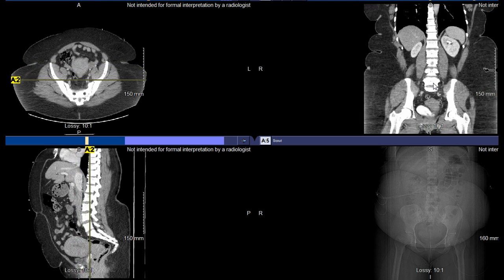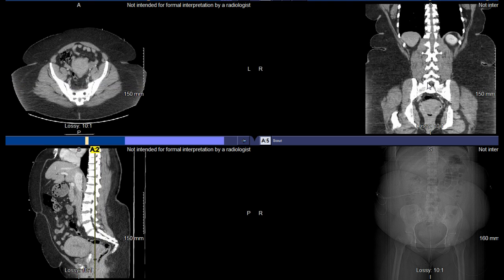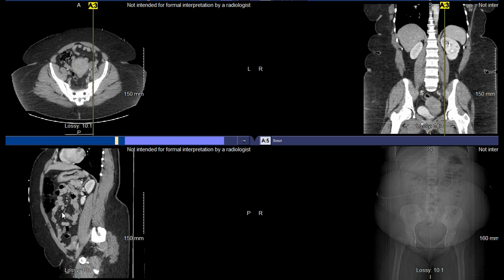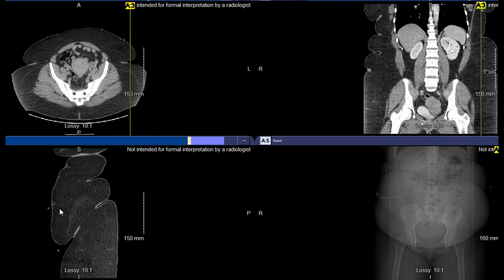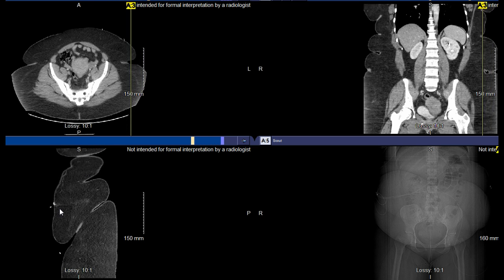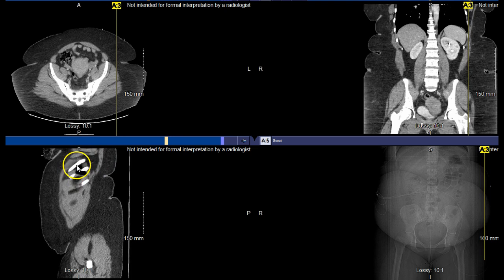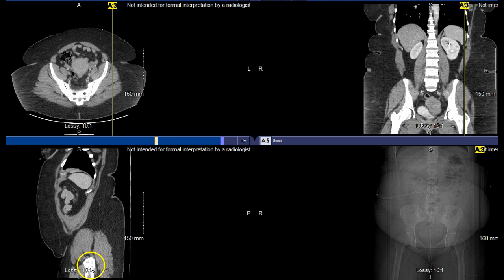So we haven't spent a ton of time looking at some of these alternative orientations, but there's a ton of valuable information associated with them. Just as an example, we can go through from one side to the other side. In this case, we're going to go from patient left through patient right. So we're on patient left now, channeling through the body. You can see where the ribs are, where the lungs are. You can see the area of the femur here.